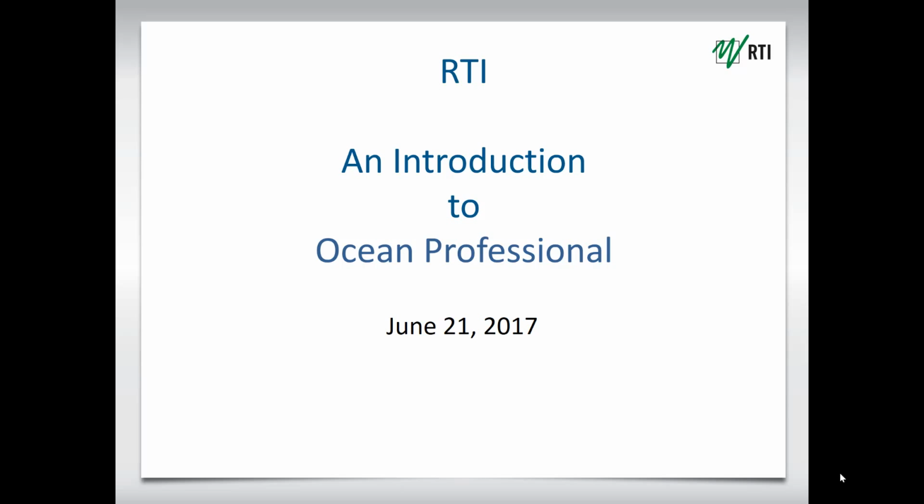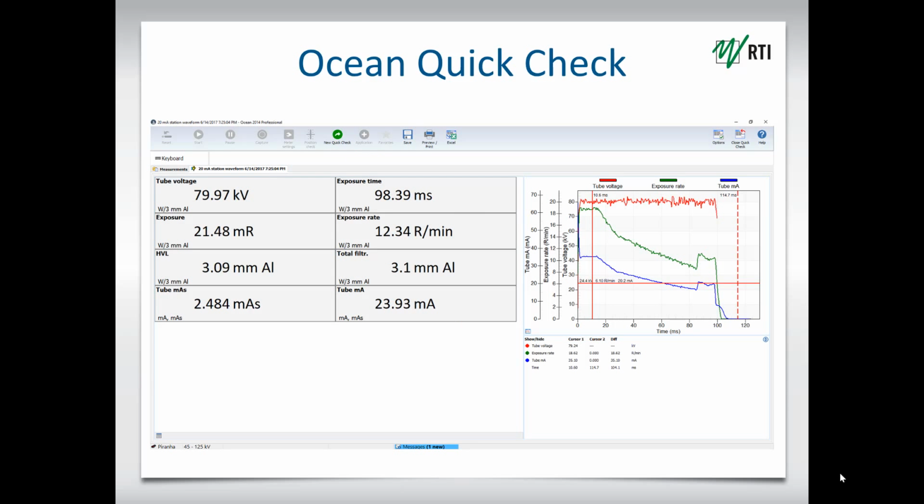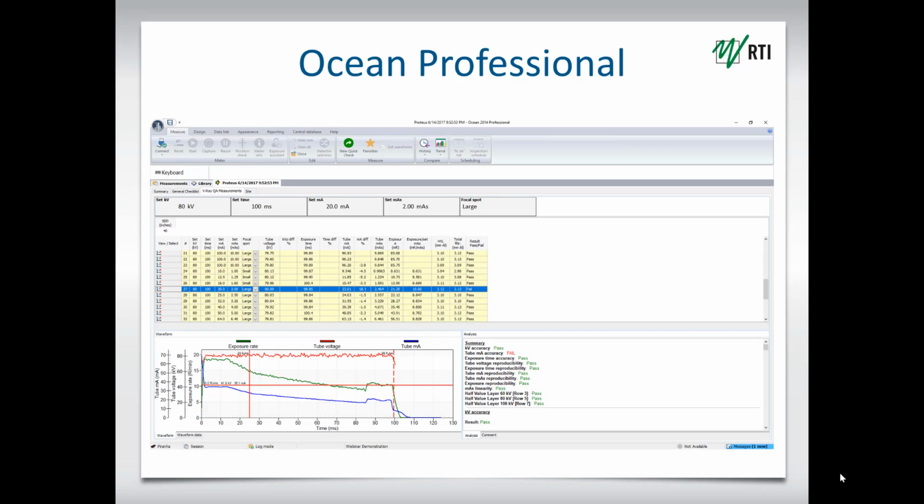The title for today's webinar is An Introduction to Ocean Professional. In our last RTI webinar, we gave an overview of Ocean Quick Check, which is a module within Ocean Professional for doing exactly what its name implies. It is for doing quick measurements. Today, we're going to look at Ocean Professional, which is unique in its capabilities.